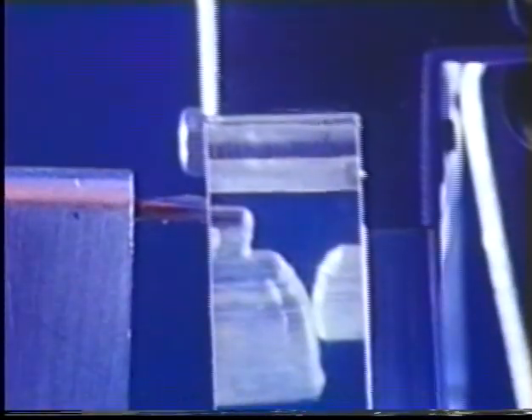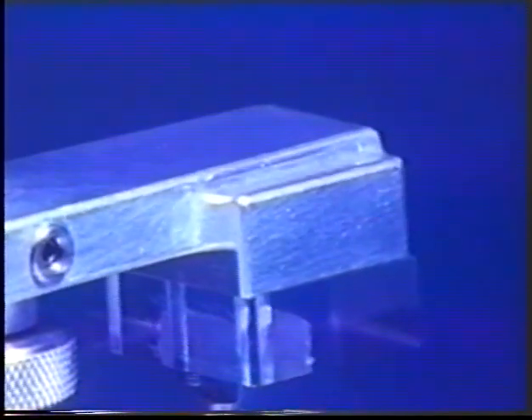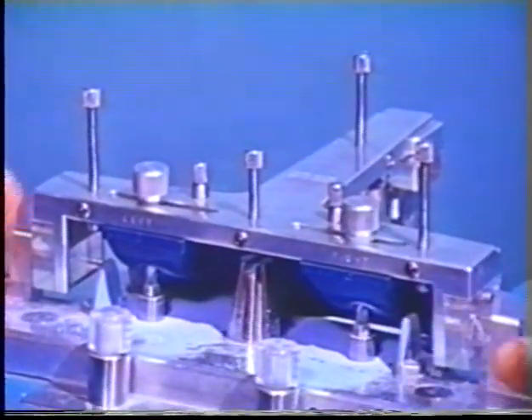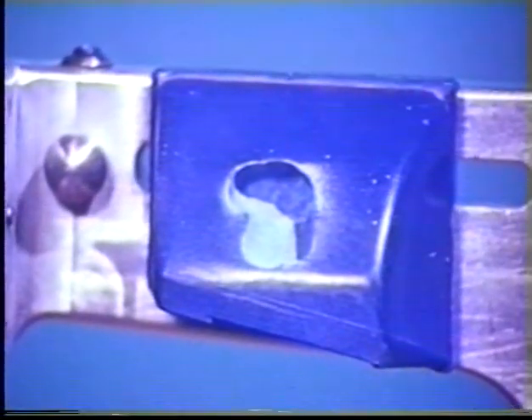A closer view of the guide pin shows the lateral Bennett shift and backlash, the medial Bennett shift, and the Bennett and orbiting paths. This view shows the anterior recording of the lateral border movements. Note the twisting motion of the frame as it rotates and translates in the 3 planes of space. After the border movements have been generated in the analogs, the guide pins are retracted and the analogs examined at close range. In the right analog, we see outlined the border movements including the Bennett, orbiting, and protrusive paths. Here we see the same movements on the left.